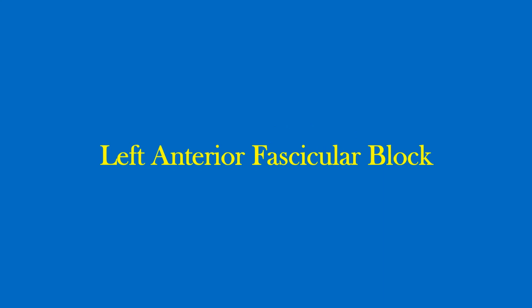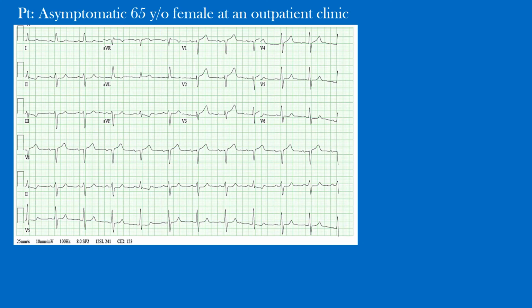In this lecture, we will look at an EKG that demonstrates left anterior fascicular block, which is also referred to as left anterior hemiblock. Here we have the EKG of an asymptomatic 65-year-old female that came into this outpatient clinic. Pause the video and take a few minutes to review it. Start the video when you're ready and we'll go over it together.